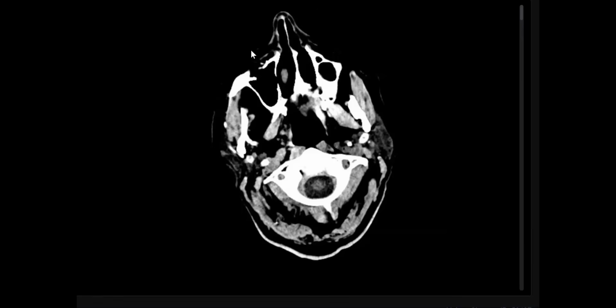This case, elderly patient, suspected stroke. You can scroll and tell me what are the findings. Yes, sir. I've been provided with axial section, CT brain. At the start, you can use one click only, then scroll or use the up and down keys. It's not happening, I will do it for you. No problem. Yes, sir.